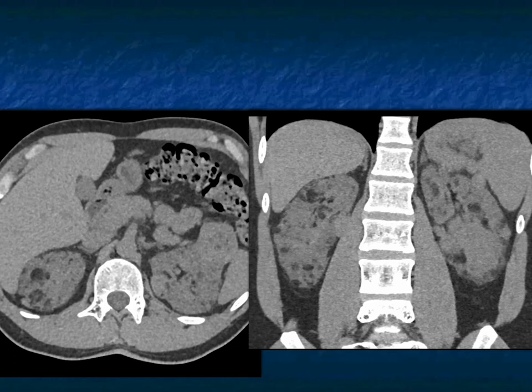This patient had abdominal pain, and you can see that we did a very, very nice example of non-contrast kidneys, but there are multiple lesions present. Most of the lesions are fat. If you put cursors on them, they measure between -50 and -100. There are some solid masses present, but when you have angiomyolipomas of the kidneys, of course, that's what I'm thinking about with fat, not all the lesions are 100% fat.